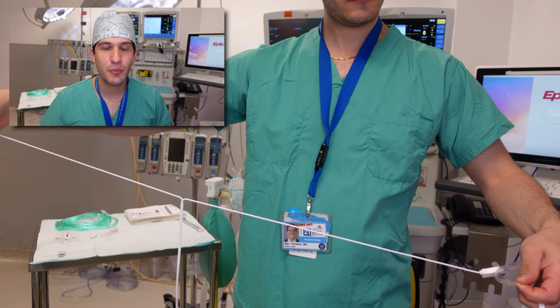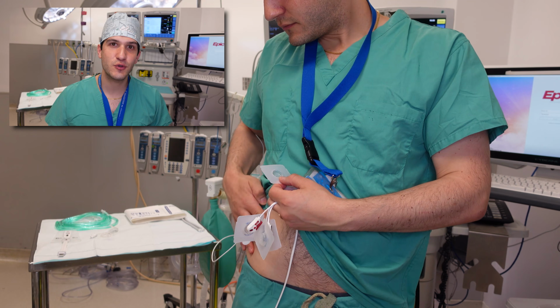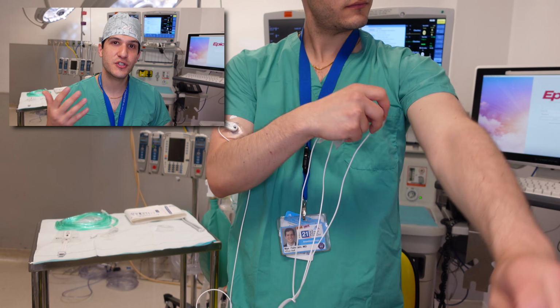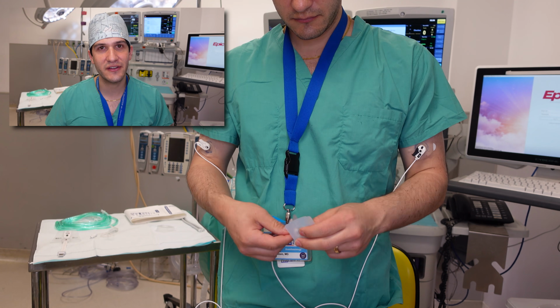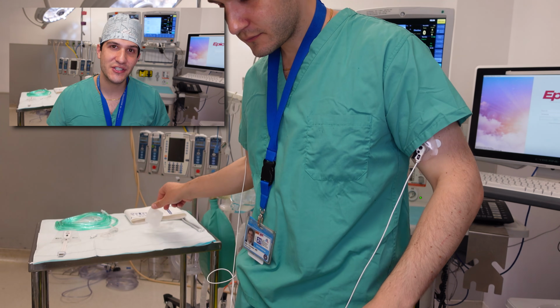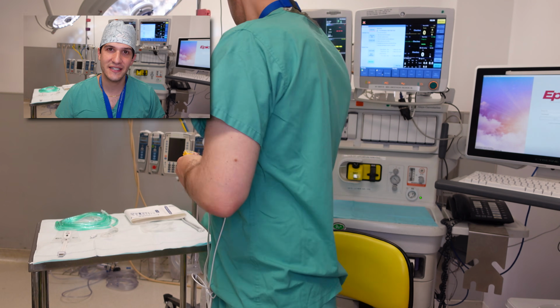Also, just a quick tip, one of my favorite mnemonics is to help set up EKG leads and to remember which colors go in what orientation. So the mnemonic is smoke over fire, which refers to the black EKG lead over the red EKG lead on the left side, and also snow over grass, which is the white EKG lead on the right side going over the green EKG on the right side.